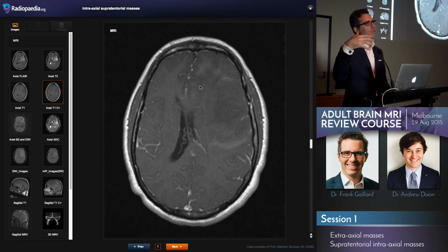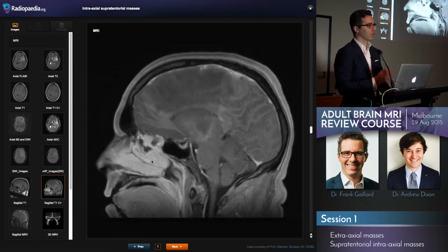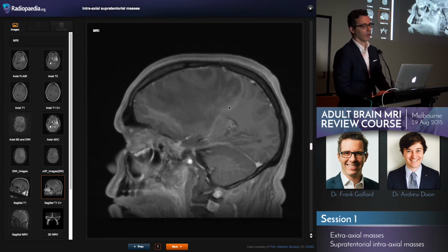Your body's reaction to this demyelination is causing the enhancement, and it spreads along until it abuts something that doesn't burn, grey matter. So where it hits cortex or deep grey matter, it stops enhancing, and you end up with this open ring sort of enhancement, which is also characteristic of multiple sclerosis in smaller lesions, small C-shaped regions of enhancement. And when you see that, you really want to be quite forthcoming that this is likely to be tumefactive demyelination, and try and hold off biopsy if at all possible.